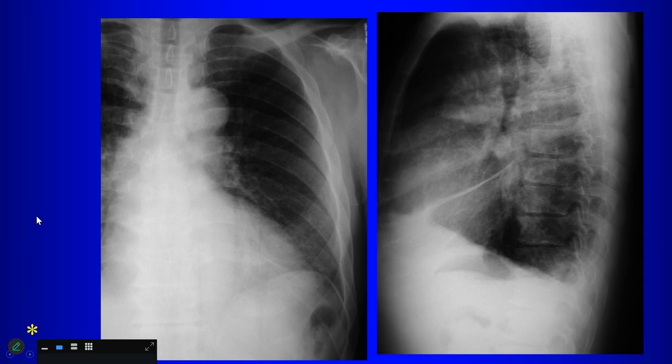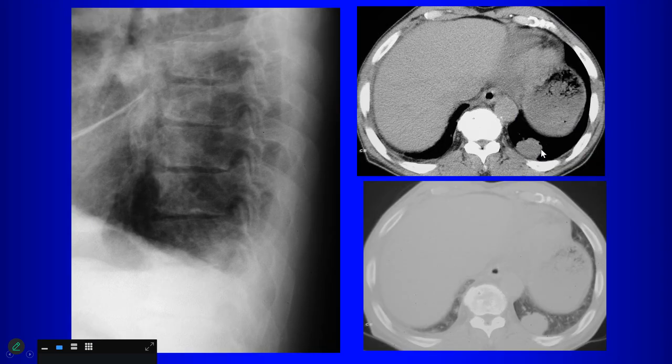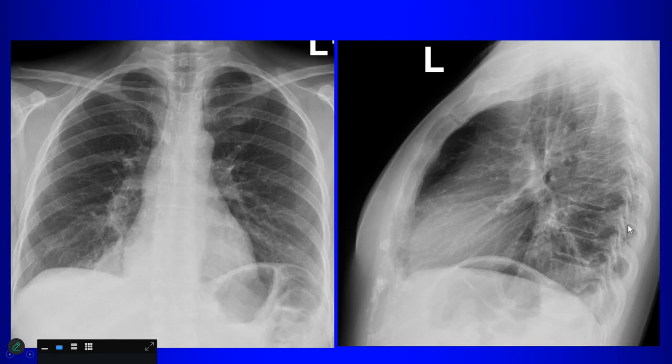This one's somewhat more subtle. When you look at the neuroforamina on the lateral view, do you notice anything? Yeah, inferiorly. So we'll pull out the old films, 4 years prior. That's what the neuroforamina looked like before. That's what it looks like now. Cancer. How about this?